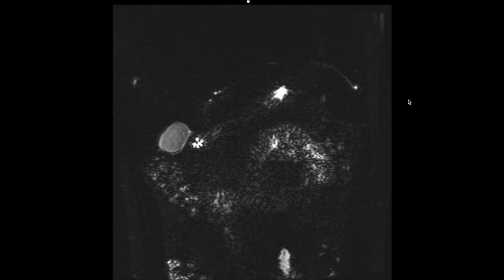Next, we talk about our MRCP images. And so as you can see, our MRCP images are just very heavily T2 weighted images. So things like the duodenum here that's filled with fluid is going to show up as bright. But what we're trying to focus on here is the biliary system. So this is the CBD that's quite beautifully imaged. We have our intrahepatic ducts here with our left hepatic ducts going to the left lobe here, and our right hepatic ducts on this side over here.